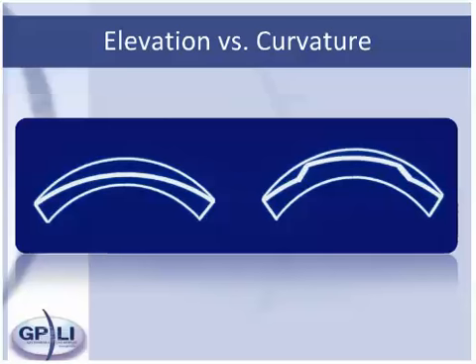There is a difference between elevation and curvature. These two images have the same curvature. However, the image on the right is clearly higher. This difference between elevation and curvature affects the contact lens fitting.